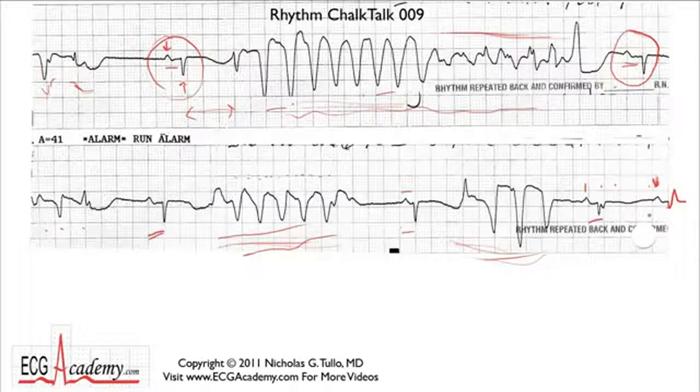Anyway, we've got a sinus bradycardia, or barely a sinus rhythm, but then we have these wide complex tachycardias. When we're figuring out where a wide complex tachycardia comes from, what should we be looking for? Well, how does it start? Is there a P wave in front of the first beat? Because that's a really important clue. If you see a P wave with a normal or a slightly prolonged PR interval, then it's most likely atrial, and you start to think about Cardizem for some kind of atrial arrhythmia with aberrant conduction.